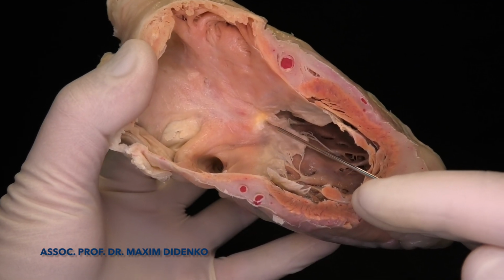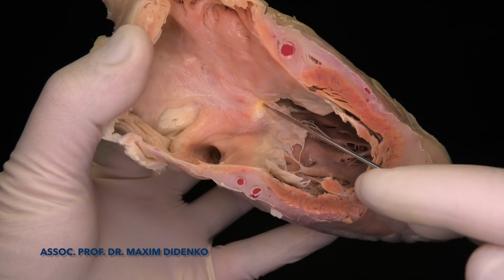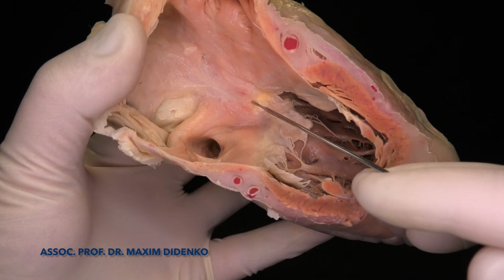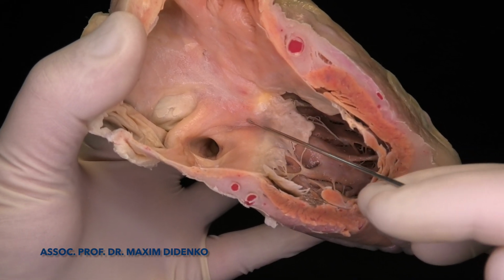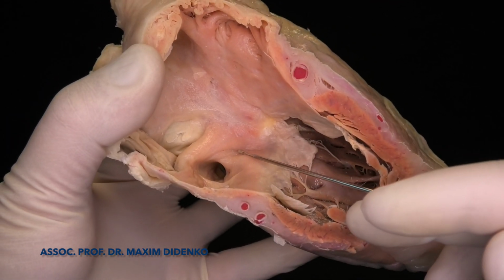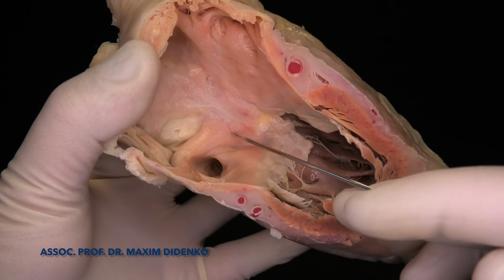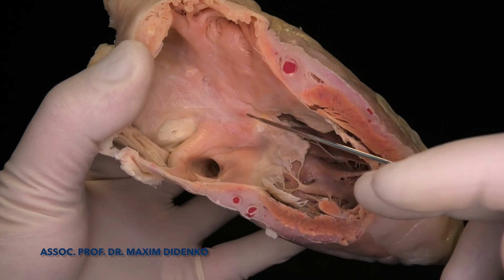So the his bundle is located here, just below or on the lower part between the membranous septum and muscular septum, actually within the fibrotic part. Just below is located compact part of AV node here. Slow pathways is located here along the tricuspid valve. Fast pathways along the tendon of Todaro and Eustachian ridge and anterior limb of fossa ovalis.